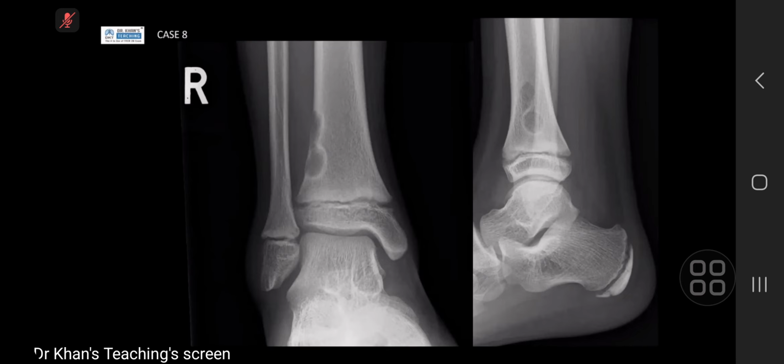Based on the appearance and location, my differential would be osteoid osteoma. Okay, can I ask you just to tell me if you think this is aggressive or non-aggressive first? It has caused a bit of deficiency in the cortex, but based on the location and appearance, I would still designate it as non-aggressive. Good. Okay, so non-aggressive. Tell me what you know about an osteoid osteoma. Why do you think this is an osteoid osteoma? It's based on the cortical location, but it's not that diaphyseal. Yeah, my second differential would be a non-ossifying fibroma.